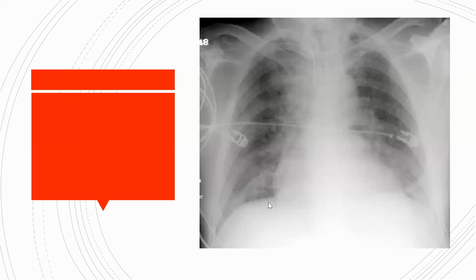I'm going to reveal the answer because it was a difficult one. This is pulmonary edema. So we haven't gone through it because it's more of a cardio thing than a lung thing. But this is, listen very carefully, this is when there's fluid inside the lungs, but not inside the pleura, okay? So this is the blood vessels inside the lungs that are leaking out, okay? It's called pulmonary edema. This is why everything just seems white.